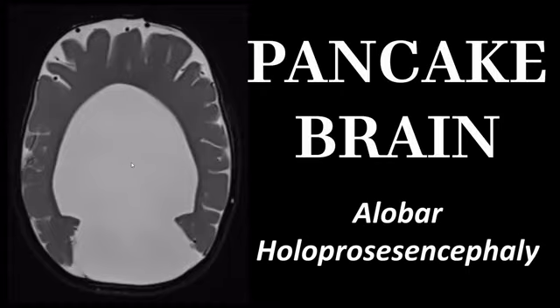This is a pancake brain, and this is, I believe, the final sign of this presentation. Also infrequently seen, it is associated with a rare fusion abnormality, or rather cleavage abnormality of the brain called holoprosencephaly. Holoprosencephaly can have various degrees of severity. This is the most severe kind, called alobar holoprosencephaly.